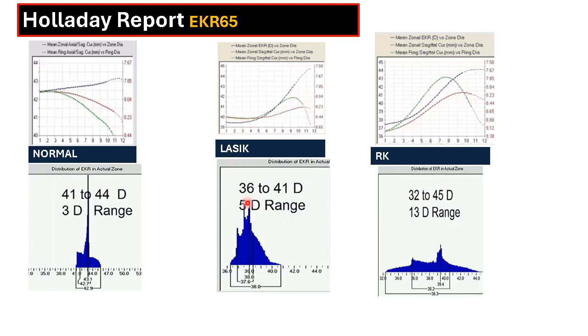So I expect that this patient will have good visual acuity, and as far as the glare or the aberrations that he will face, they will be minimal in a zone of 4.5 millimeter. But for example, at night when the pupil gets dilated, he will notice glare and halos because of the separation of these three lines, and he will complain of spherical aberrations and also reduction in the quality of vision. However, within the 4.5 millimeter zone, under mesopic conditions, he will be all right.